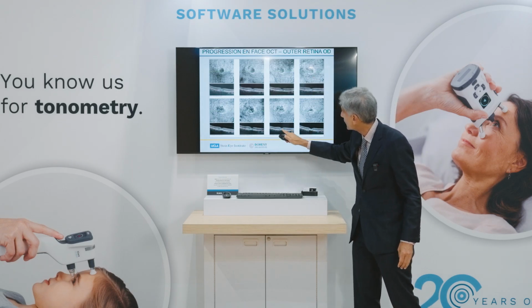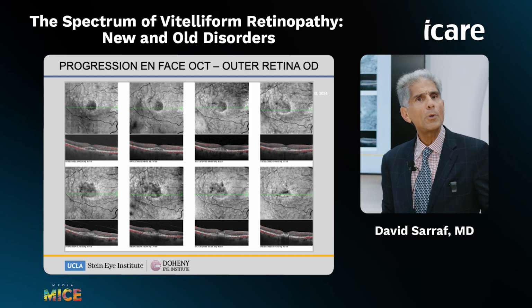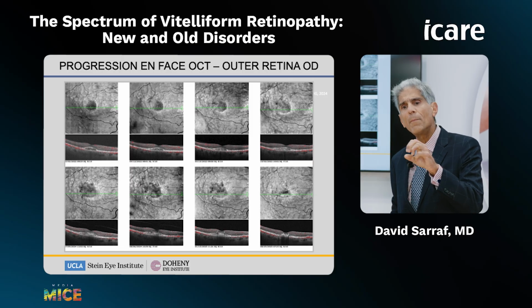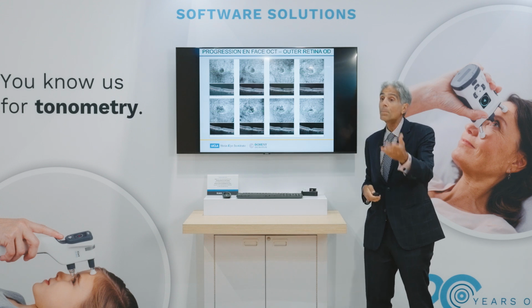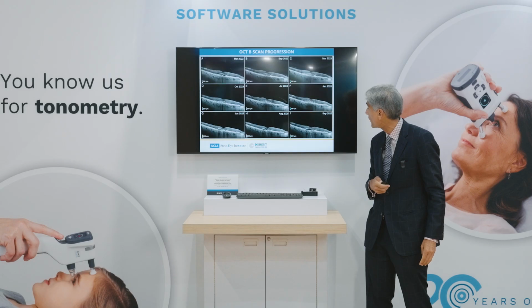And you can see that the vitelliform lesion is beginning to break down. And that's not an unusual manifestation of these vitelliform lesions. They can become liquefied, or they can also be associated with scarring or RPE atrophy, which I told you is present in 2/3 of our patients.